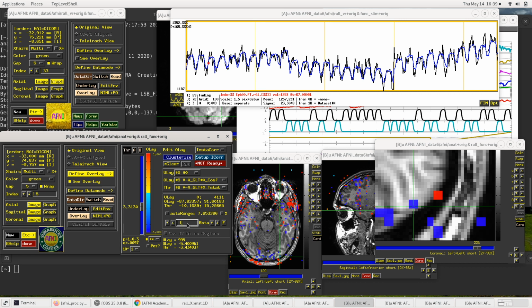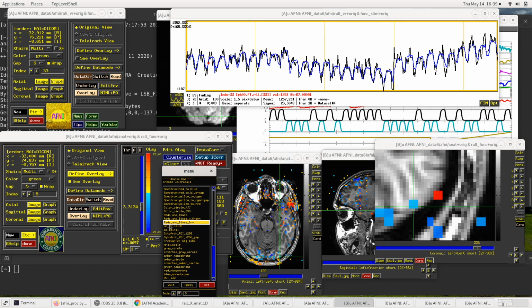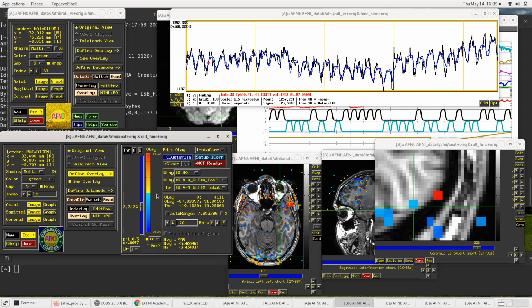So let's bump this up to maybe, I don't know, 20 just to see. If I type in 20 here, now you see the scaling goes from negative 20 to 20 with 0 being in the middle. If I right click on the color bar, you can choose the color scale, currently reds and blues inverse, which you probably can't read here. It's reds on top and blues on the bottom with 0 in the middle, so there's a clear distinction between what's positive and negative.